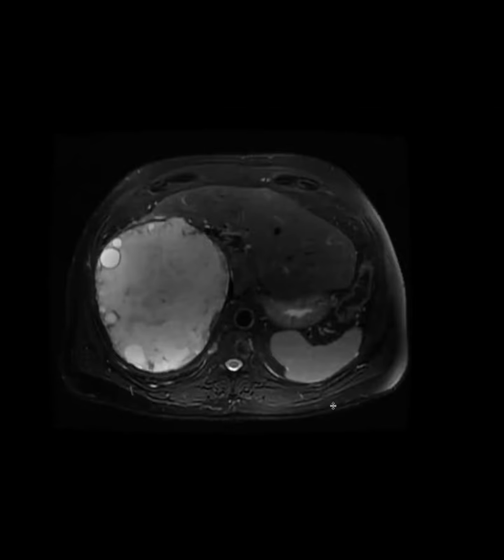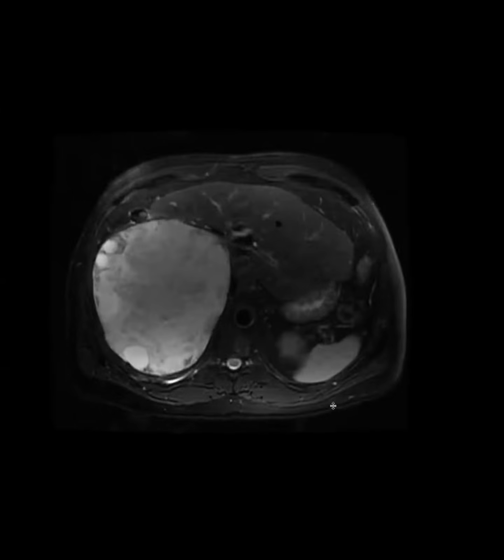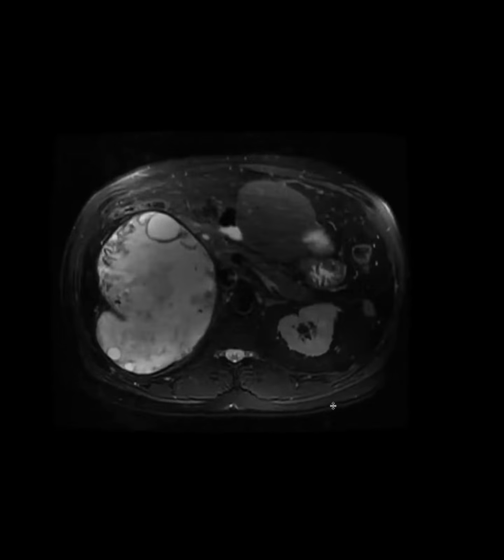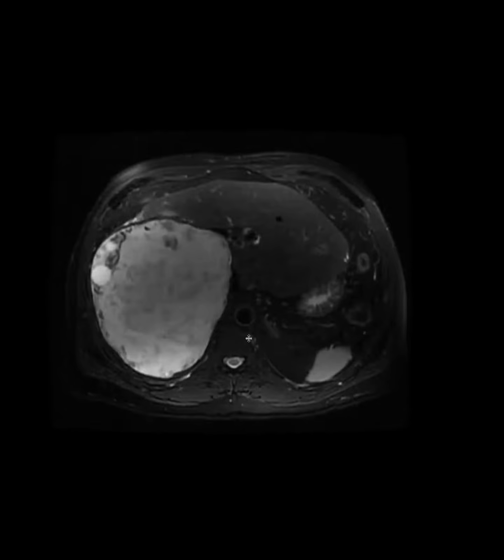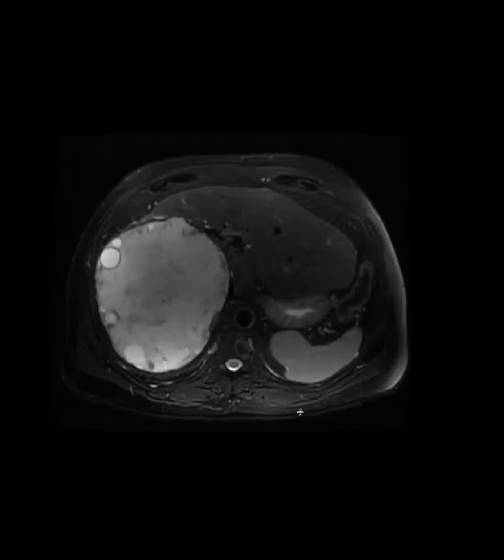So is this another case? Yes, this is also a pathologically proven case. And this is more of the MR imaging appearance of that follicle and the ovary appearance that you and Victoria discussed earlier from that radiographics paper. Well, I call it the ovary in the liver appearance. Yes, ovary in the liver, like the palisading follicle that we can see, for example. Yeah. So cool.